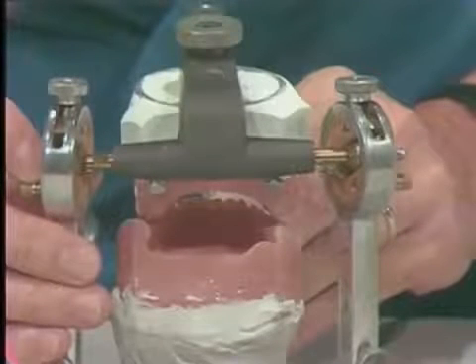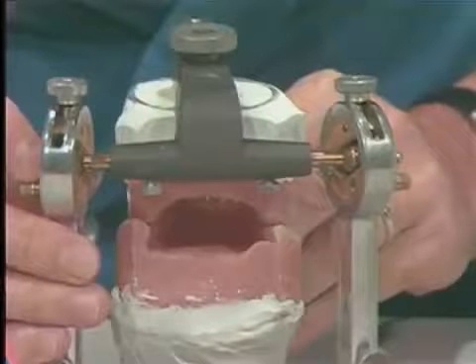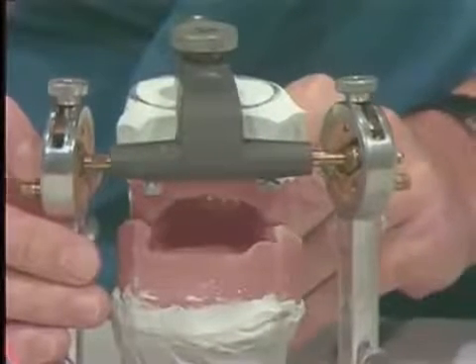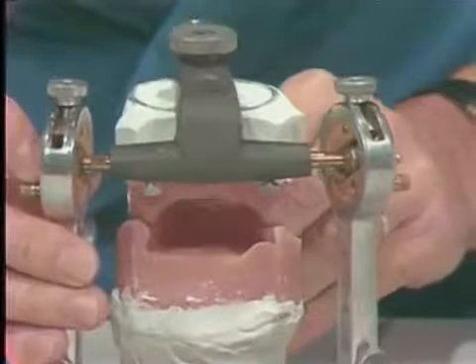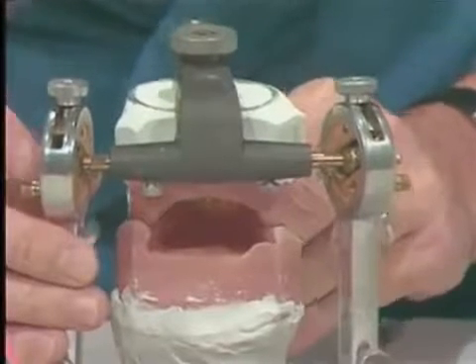But now you try this yourself and move your mandible into left working, and you find that your mandible moves left. You should do this. Try this on yourself now. You move into your left working position, and you find that your mandible goes to the left. So you can see there's a reverse direction when you go to the articulator.